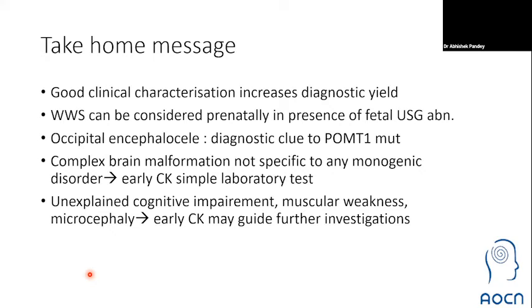a POMT1 mutation. What I want to highlight is that this child in utero had a hydrocephalus and an encephalocele, and if ultrasound is done clearly, we can also detect ocular findings on the ultrasound, and this is a strong diagnostic clue towards a POMT1 mutation.